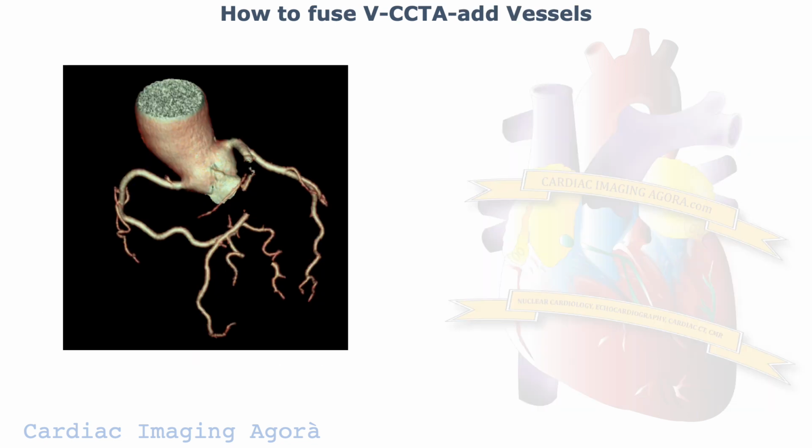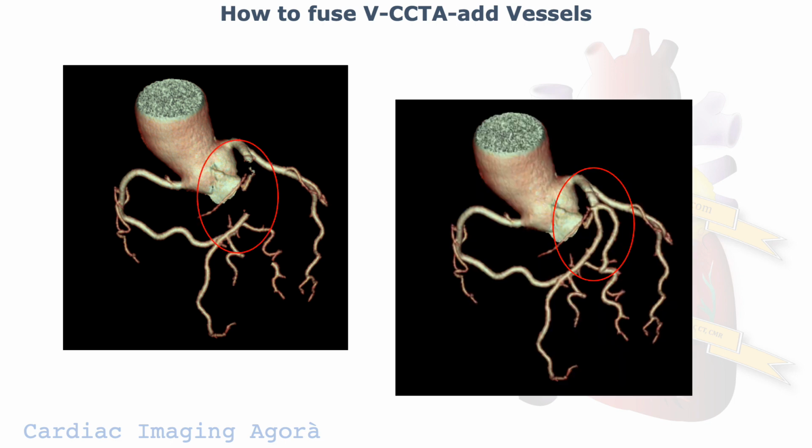Once you're certain about your segmentation, perform a visual check of the coronaries and manually add missing arteries. In this step, when the algorithm misses some vessels, it usually refers to smaller branches. I show you now a more extended defect, and how the algorithm here missed the entire part of the proximal to mid LAD, and how I manually, basically with thresholding in this case, included it again.